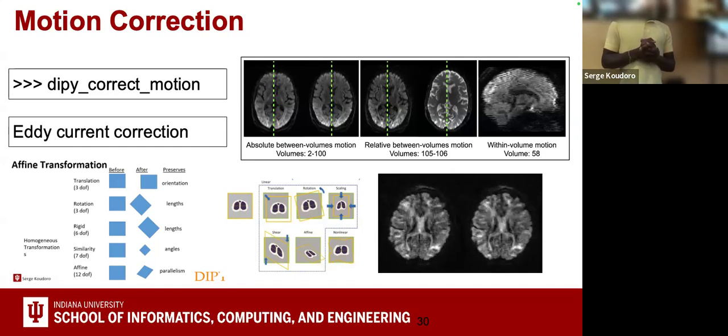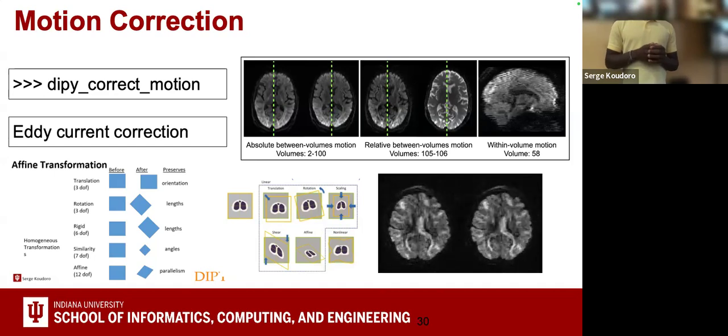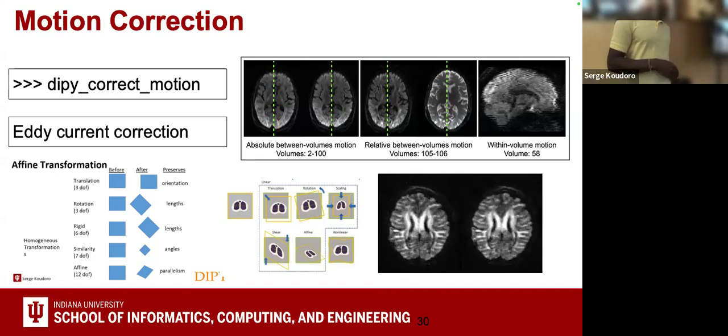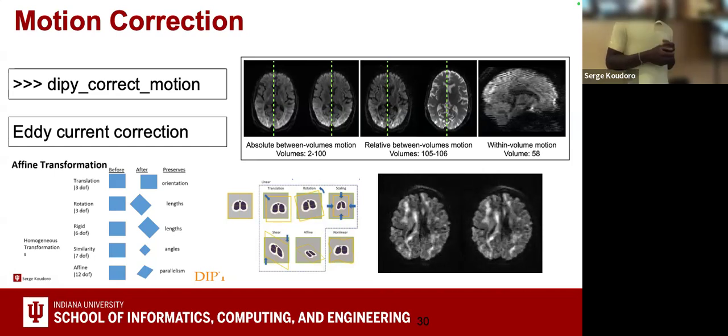corrected by doing a rigid registration and an intensity normalization, intensity correction. So why don't we do it? We don't do it in our lab, or we do it sometimes, depending. It's just because the patch2self that we saw before as a denoising algorithm does an intensity reduction, does already an intensity normalization. So it corrects the intensity in different places. And if you combine that with a rigid registration, which is what FSL does, you have kind of the eddy current correction.